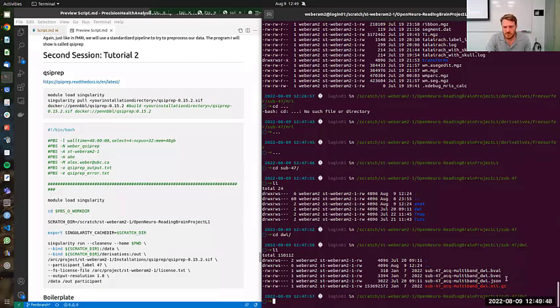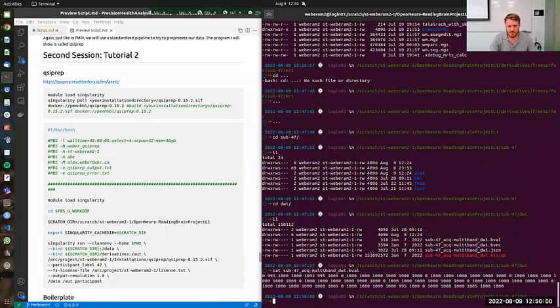I think actually we can find out what those strengths are here. So we have our JSON file, but now we also have this bvec and this bval, the b-vector and b-values. So let's look at what those look like. These are our b-value strengths. So our first image is 0, then 995. I don't know why this person has these small changes in b value.